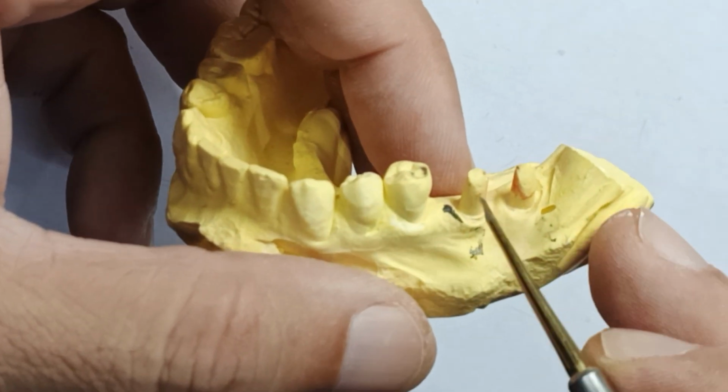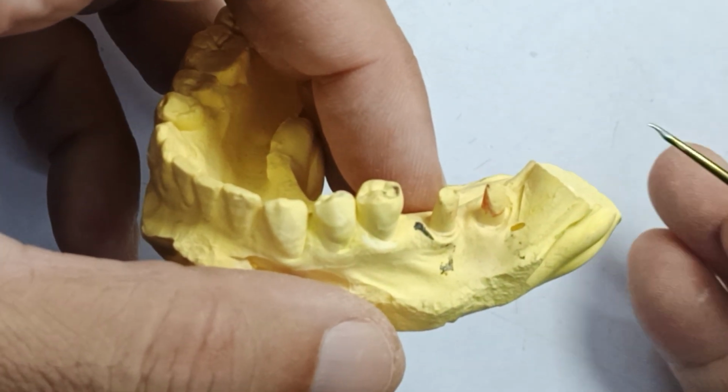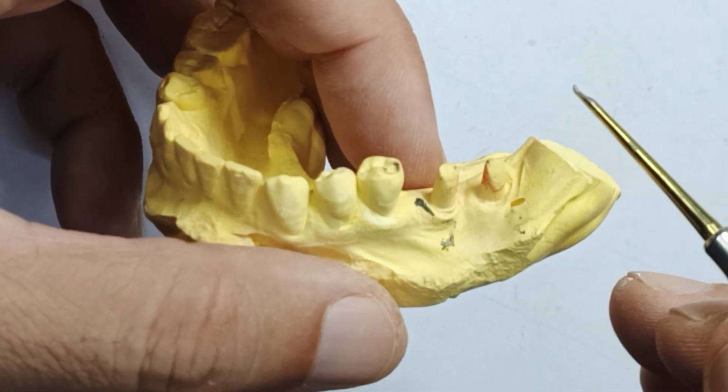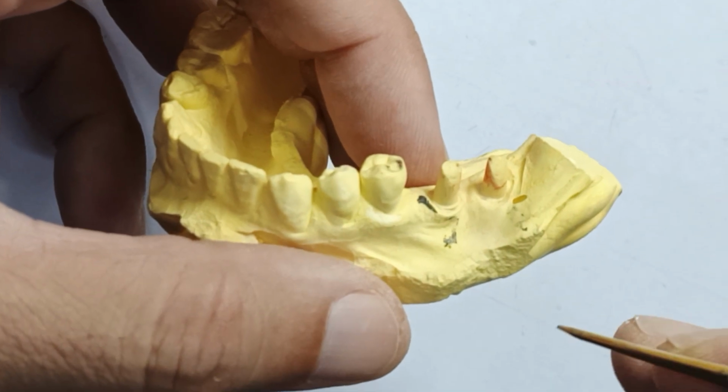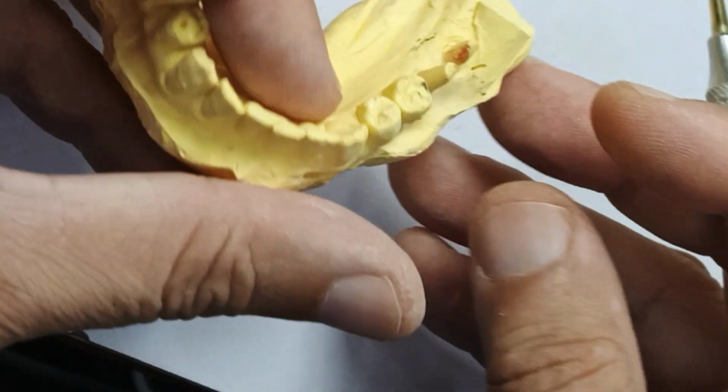It would have been better had they picked up these abutments into the impression with lab analogs and sent it to the laboratory so they could fabricate the final crowns on the abutments that actually are going into the patient's mouth, and then you put them inside the mouth and you're fine.